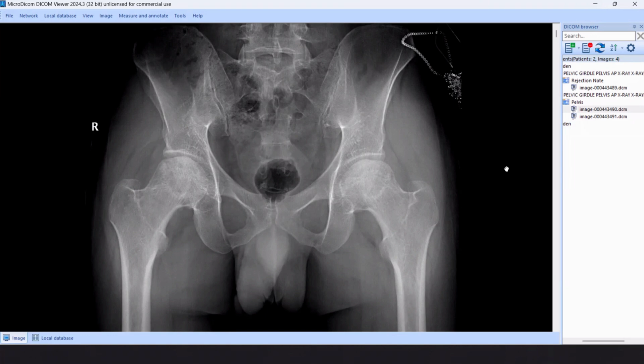I can't appreciate any acute bone injury, but I can see that there is some sclerosis in the right femoral head. Very good. And it is heterogeneous in pattern, with small lucent areas as well. I can't appreciate any other abnormality there. So I think there is a heterogeneous pattern of the right femoral head with small lucent areas.